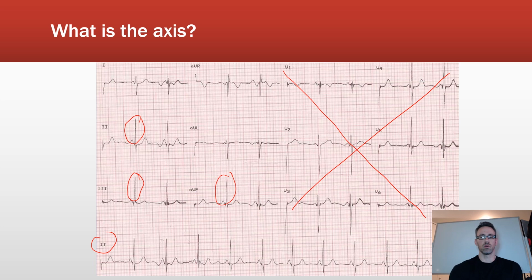So we take a look at 1, 2, and 3. Do I see any biphasic waves?